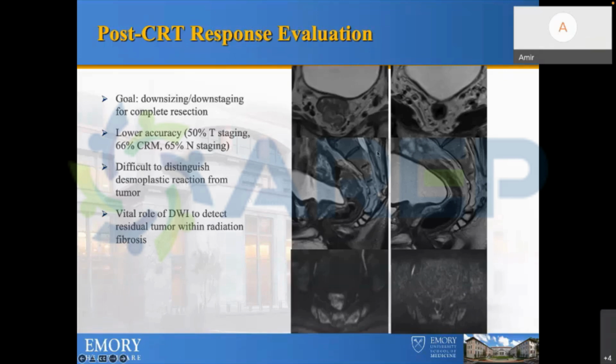We see this, and we put a line where the tumor is. And remember, nowadays we do rectal gel, so we see the tumor better. Then we save an image to tell them, this is the tumor. Prescribe the axial along this axis, and they proceed with that, and then they do perpendicular to that, which would be coronal. So first scout, then sagittal. Sagittal is standard. We don't need to intervene with the sagittal.